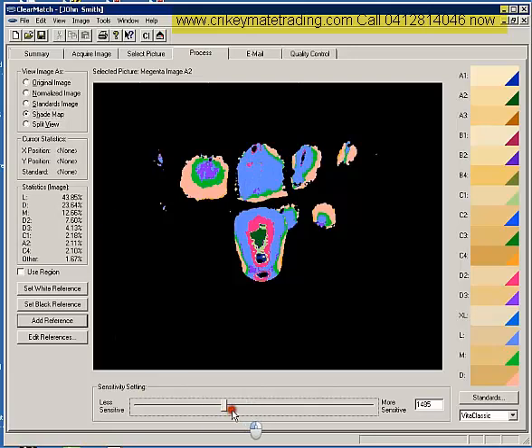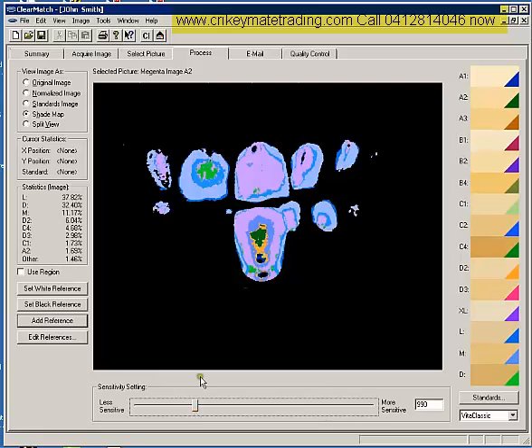We can also set the sensitivity, by the way, just so we capture more of the tooth, so the sensitivity is not as much. Once again, we got that light, medium and dark translucency. Now this does not tell us what shade this translucency is derived from. It simply tells us the translucency. So what we're going to do is actually just create the translucency for now. So we're going to click on that.